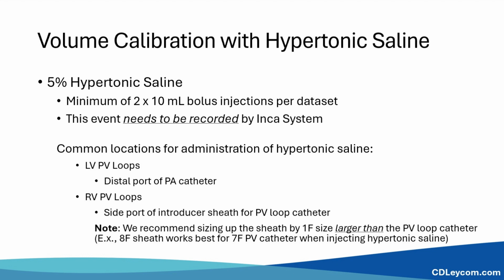Please note that 5% hypertonic saline is the minimum concentration needed to warrant the desired effect and has recently been standardized for this calibration method. The more commonly available 3% hypertonic saline concentration will not be sufficient.